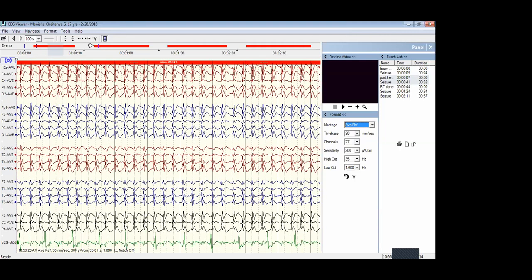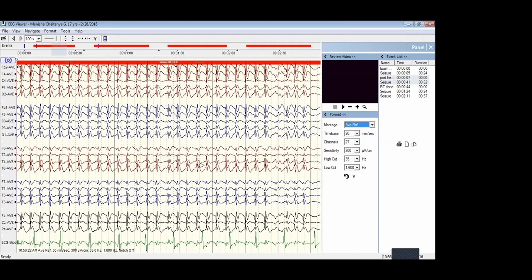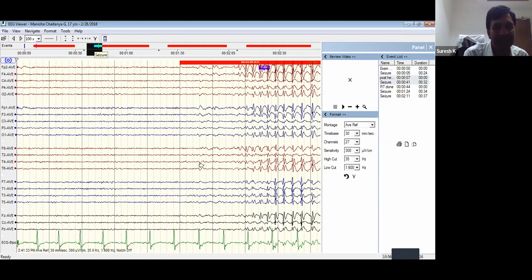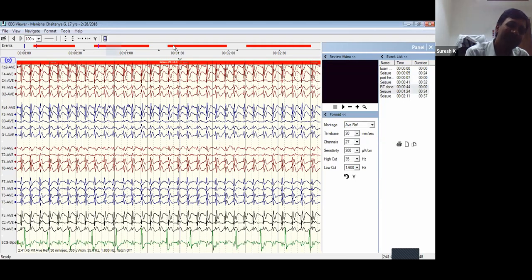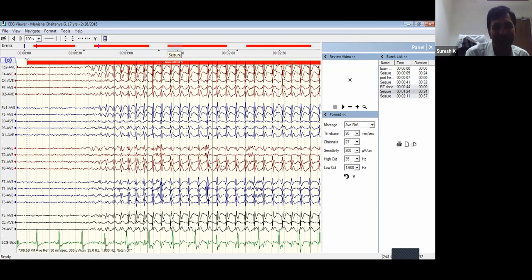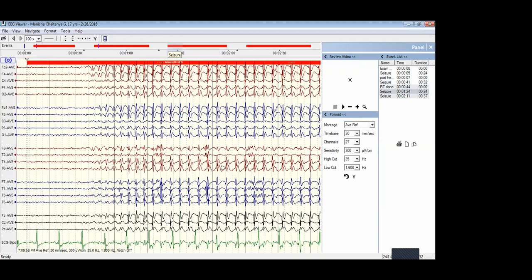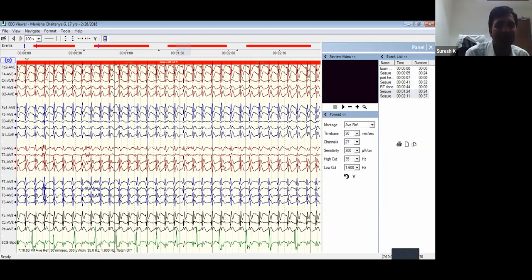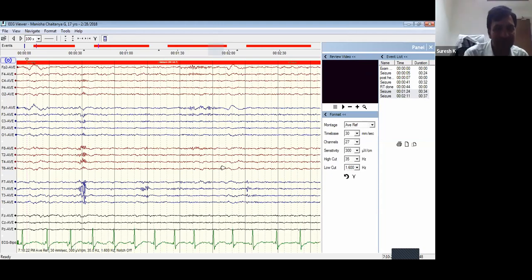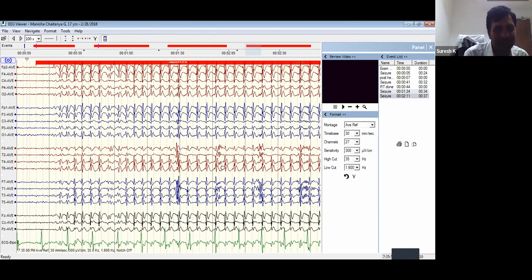I'm showing one more of the same. 10, 11, 12, 13, 14, 15, 16, 17, 18. So what do you think about this one? Same as before, you know that you are having an absence-like episode only. But if you see, the duration is much longer. The age is 17 years old. So what do you think about this one?